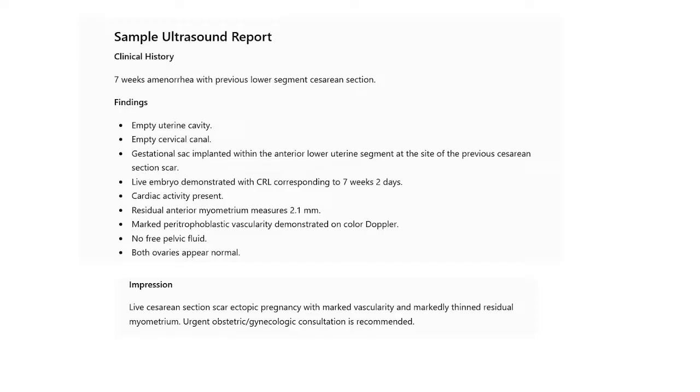So the impression: live cesarean section scar ectopic pregnancy with marked vascularity and markedly thinned residual myometrium. Urgent obstetric or gynecologic consultation is recommended.